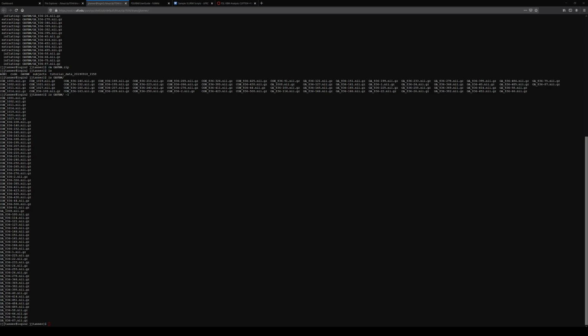And if you only had one group, let's say you're interested in is there a relationship between gray matter density, which is technically what we are assessing with a VBM analysis, and, let's say, duration of chronic pain, then we would only have one group.